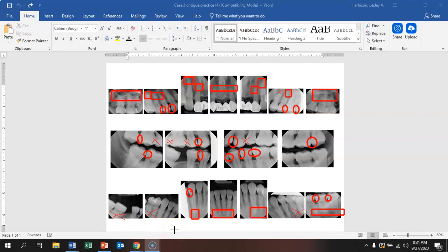So what we have here is a situation where we have, at the very least, let's start determining retakes. So I'm going to try and draw an R freehand. We know that we can't see in between the first and second molar here and the first molar and the second premolar here.